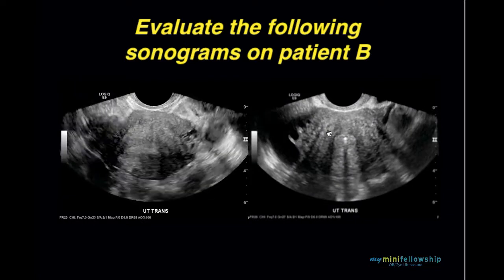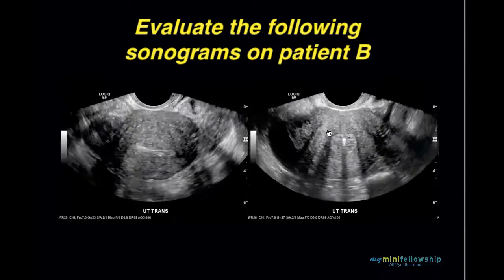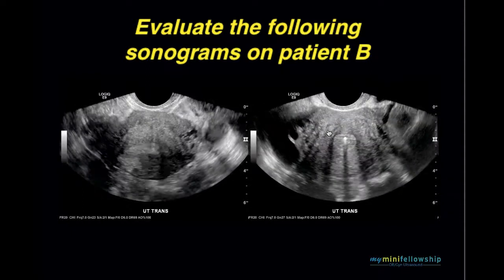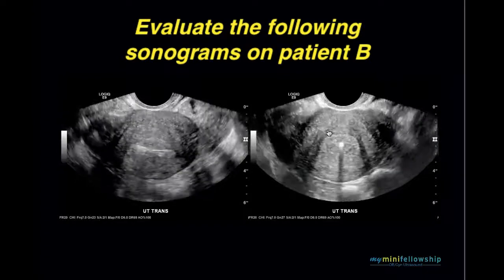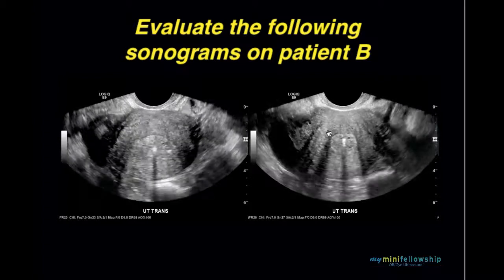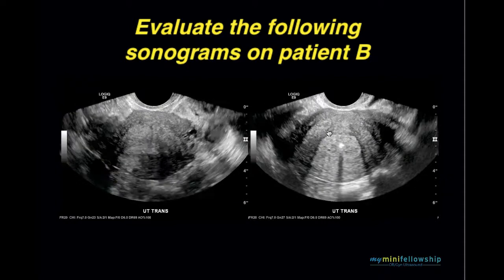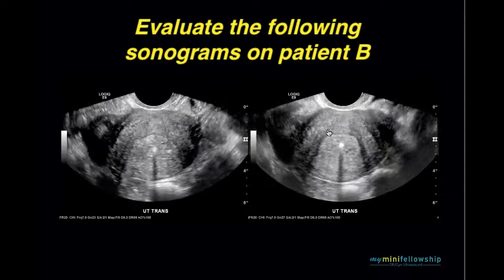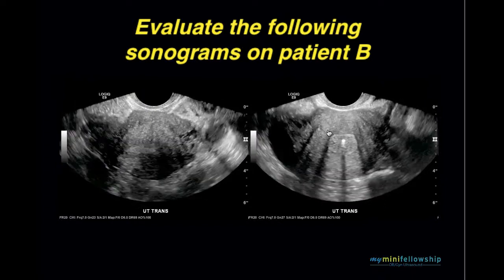Now here we do have some cine clips of a different patient. And you would say, what about this patient? The one on my left looks pretty good. The one on the right, we're just seeing the body. It looks pretty good. So basically, you saw nothing fundamentally wrong with either IUD in the images that I showed you. Admittedly, these are limited images.